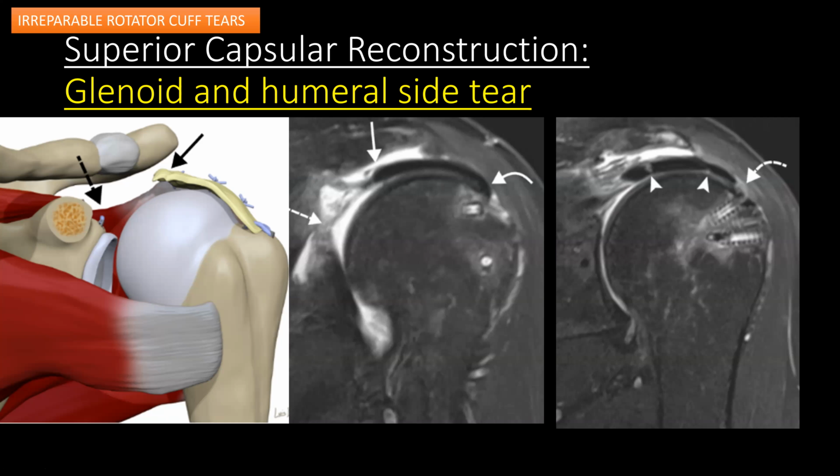And the reason is that at one of the anchors, you can see there is graft material, and at the other anchors, there's absence of the graft material attaching to the suture anchor, and the suture anchor is slightly backed out from the surface of the bone. One challenge in these cases is that the majority of these patients had prior rotator cuff repair, primary rotator cuff repair, if not twice, at least once or multiple times.